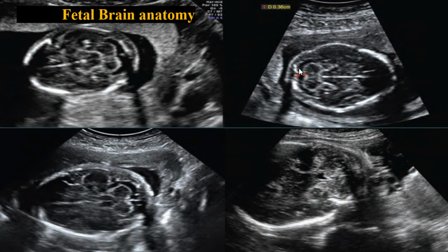This axial image of the head demonstrates the measurement of the cisterna magna from the posterior margin of the cerebellar vermis to the inside of the occipital bone, and its normal measurement is about 0.36 centimeter, and its normal range is between 0.2 and 1 centimeter.